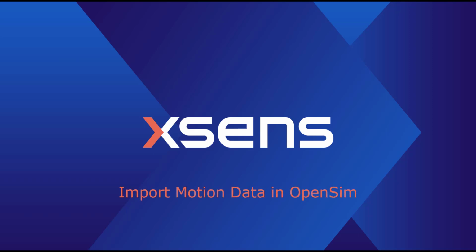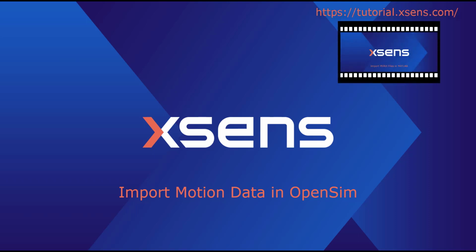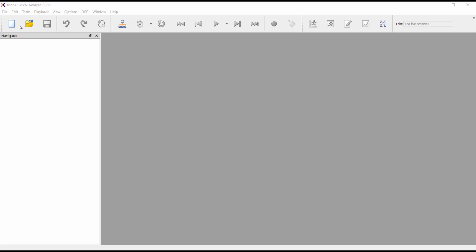In this tutorial video, I will guide you through the steps on how to import Xsens motion data in OpenSim. If you would like to know more about importing data in MATLAB, look at the videos in our tutorial page.